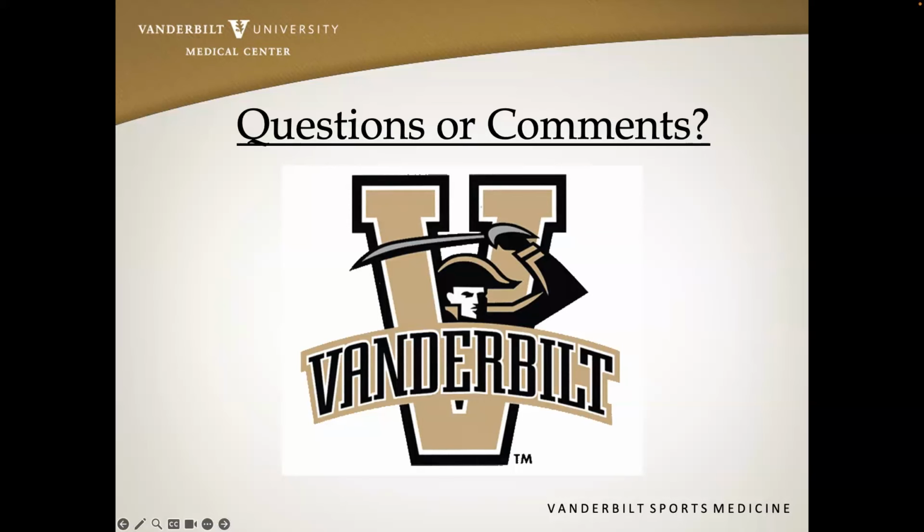I think, Stephen, you highlighted this not only now, but in your presentation with pediatrics. When you're dealing with immature bone, contralateral views are very important, as you demonstrated, Thea, as well as Doppler imaging. And then we're getting into the weeds with Doppler imaging with skeleton mature, because the pattern of Doppler imaging is very important. So in this case, if there was Doppler imaging involving the hypoechoic thickening of the tendon itself, that's likely pathologic, versus if you see a small amount of vascularity within, let's say, the apophysis itself, that may be normal vascularity. And so there's some subtle differences to look for. And again, contralateral views can help you with that.